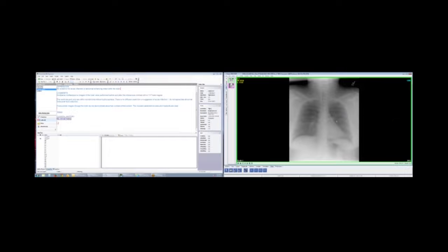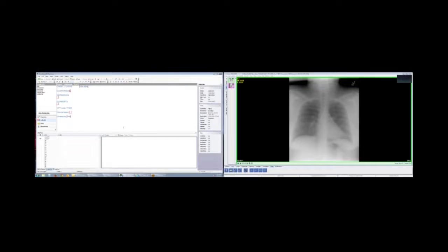Again, at any time during the dictation, the user may go back to the ImageQube patient list, select another study, launch it, interrupt the dictation, save the draft, and then go back to the prior draft. Prior dictation appears as it was previously saved.